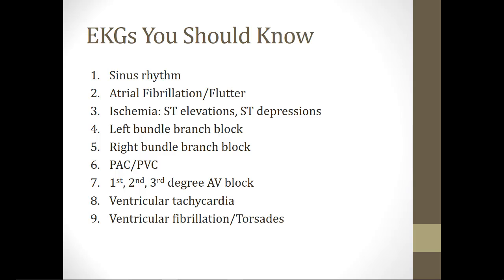Now, some of these I talk about in other videos. For example, we have a video on atrial fibrillation and flutter. There's a video on ischemia and one on bundle branch blocks. So some of these things we'll touch upon in this video here, but not go into detail like I do in the other videos. But mostly what I'm going to do in this video is try to give you my approach for how to read EKGs, and this is especially helpful on your rotations when you're shown an EKG and asked to interpret it.